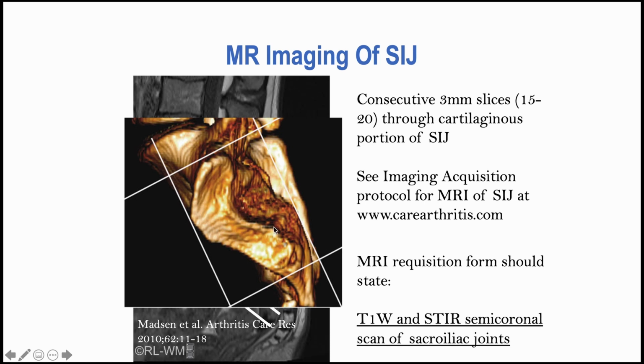Posteriorly is the ligamentary portion, and so in fact the ligamentary portion of the joint will first appear in the middle of the joint as we go from slice to slice from the front to the back of the joint. Now let's look at this using DICOM imaging.